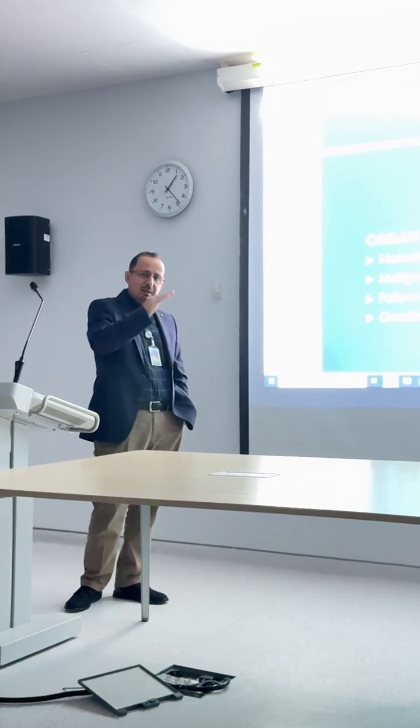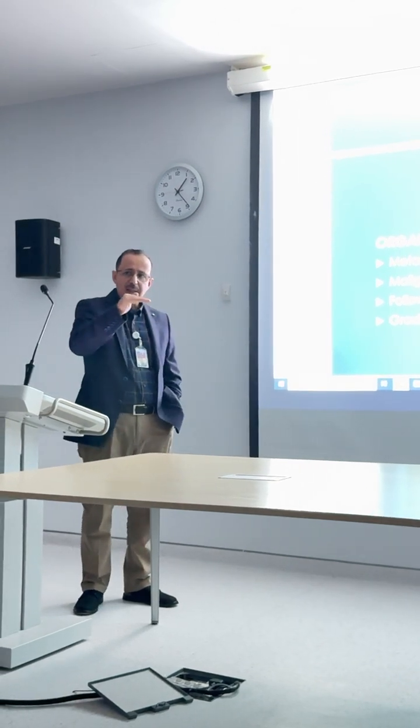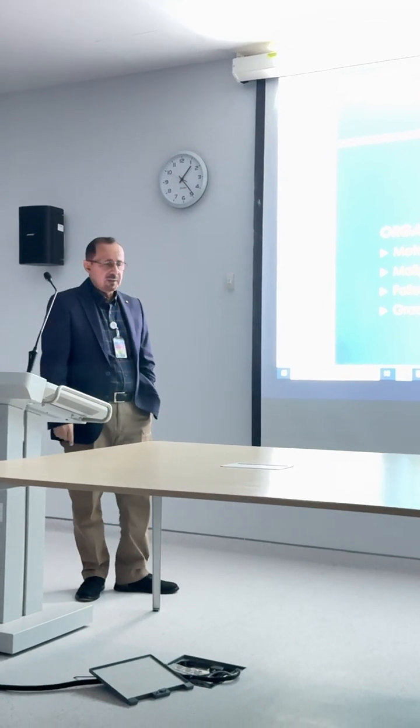But malignant lesions have lower values, so we can say that this lesion is malignant rather than benign when we are dealing with lesions or masses in the internal organs.